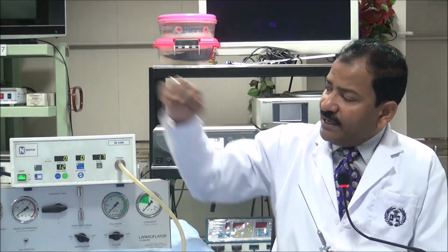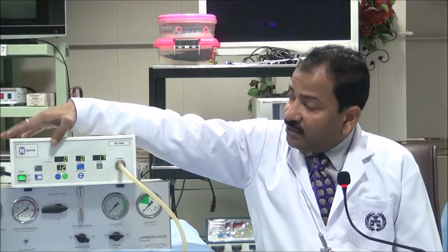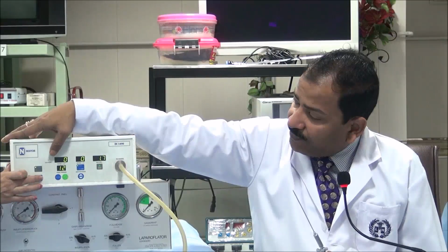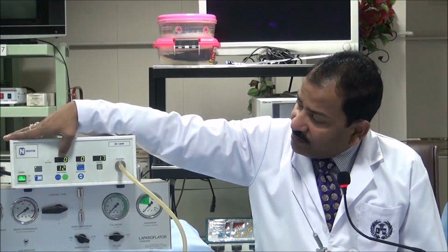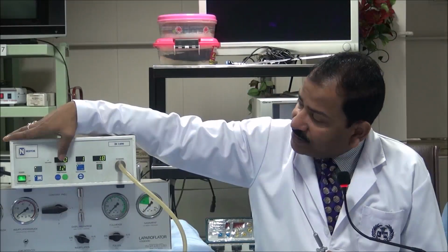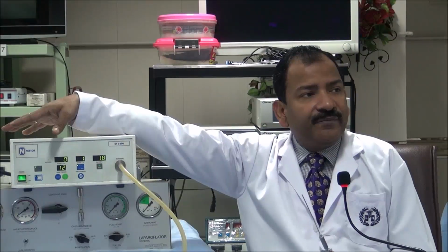The second advantage is that whenever you use the Veress needle, there is some error here. You can see sometimes 0 flow. Here you can see sometimes 0, sometimes 17, sometimes 8, sometimes 3, sometimes 16, sometimes 0. So what is the actual pressure?